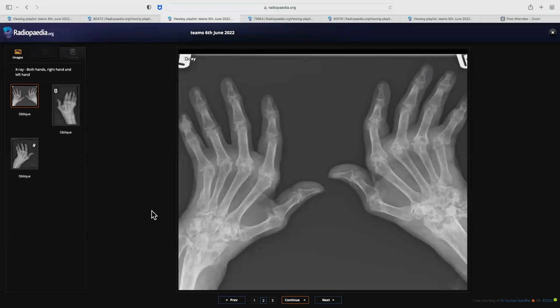So you mentioned erosions, psoriatic, marginal erosions and then overhanging edges. That covers the entire spectrum. Can you just narrow down your differential? My top differential with these findings will be gout actually.